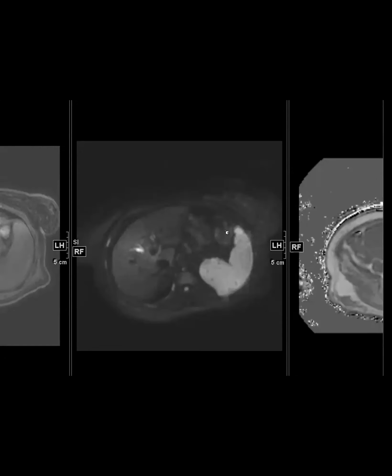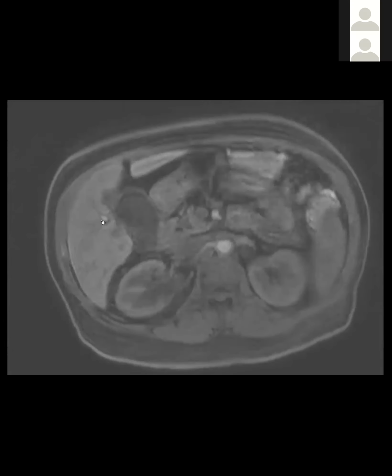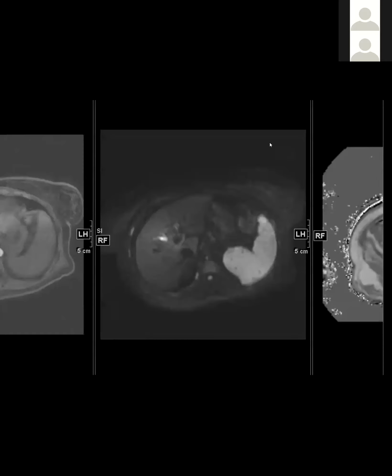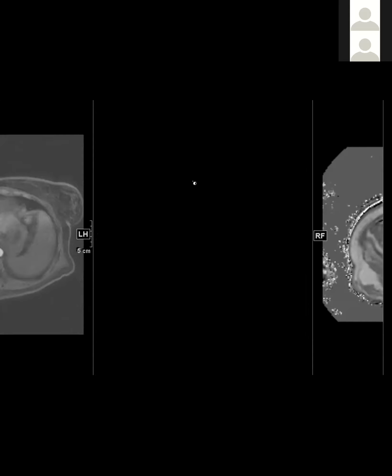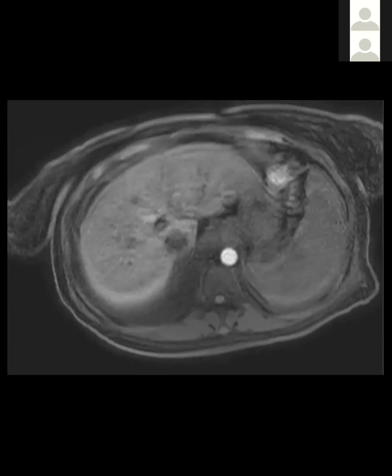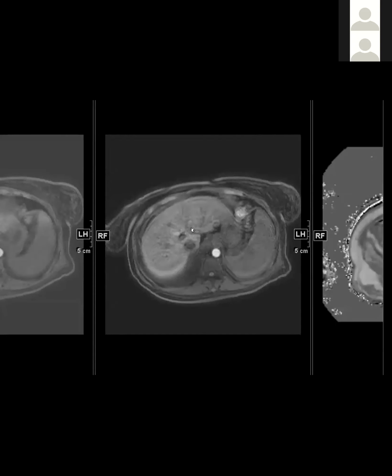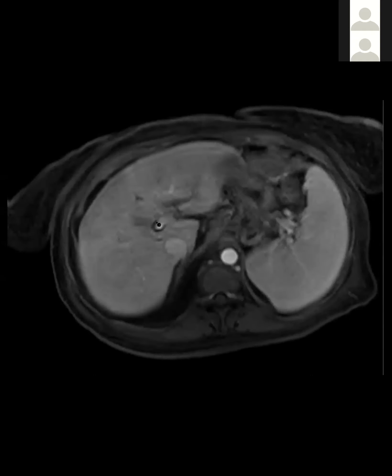Just remember that this was the pre-contrast. You can see that the same areas have very high signal intensity on pre-contrast. So when we look at post-contrast, oops, this is not post-contrast, I apologize. Our PACS got an upgrade and it's much slower than usual. So here's the post-contrast.